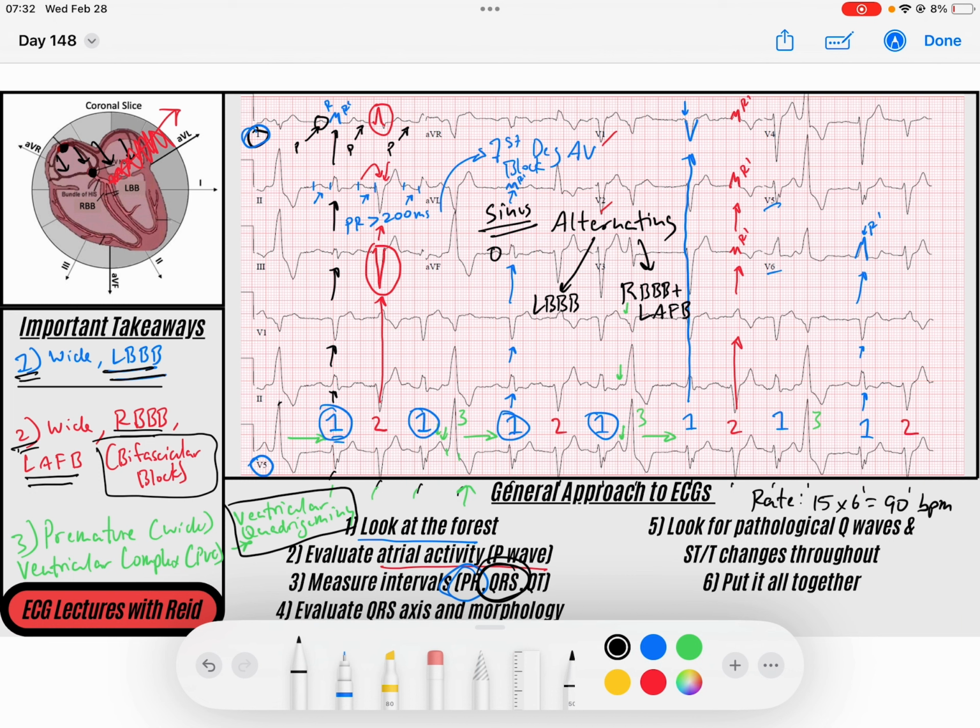So this is an incredibly advanced ECG. This individual has a lot of disease of their conduction system, right? With a normal sinus rhythm, they have these fluctuating bundle branch blocks. And so that tells me that with each beat, we have changing ability for these fascicles and bundle branches to conduct this signal. And so this person probably needs a workup. They probably need an echocardiogram. They probably need a stress test. They probably need a Holter monitor.